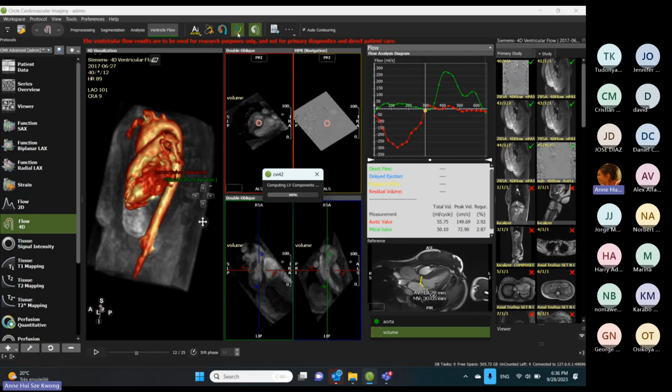So the intracardiac goal is really to have tracking of the valves, but in the analysis, you saw that I was able to place planes wherever I want, including the valves, but of course the valves are fixed. Okay, so if you want absolutely a tracking of valves, you will need to come here in order to have it.